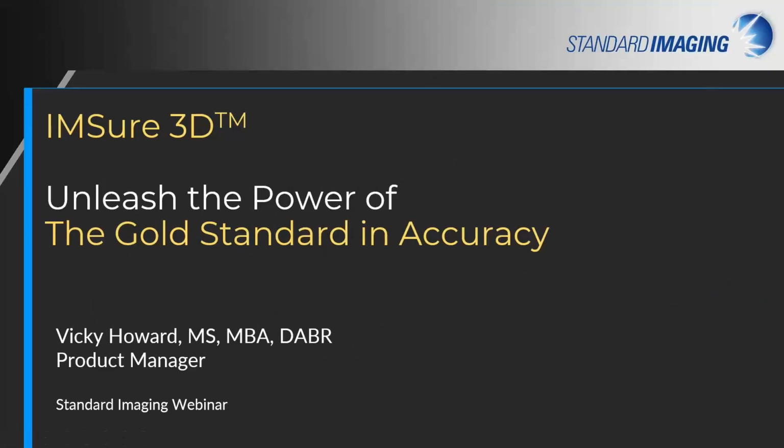Today I'm going to talk about how you can unleash the power of IMSure 3D patient QA software. IMSure 3D uses the power of a gold standard Monte Carlo calculation engine combined with an automated and intuitive QA workflow. This combination provides accurate and meaningful plan QA analysis so your physics, dosimetry, and even therapy staff can have confidence in the plans they deliver and the time to focus on what matters, which is your patients.